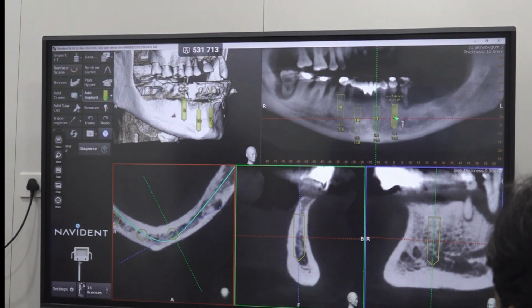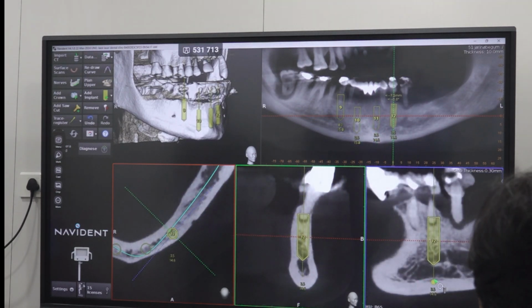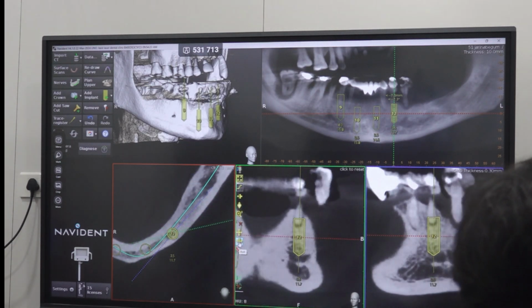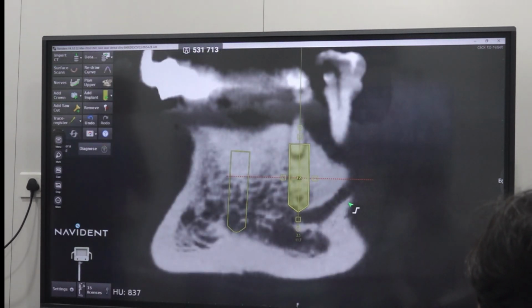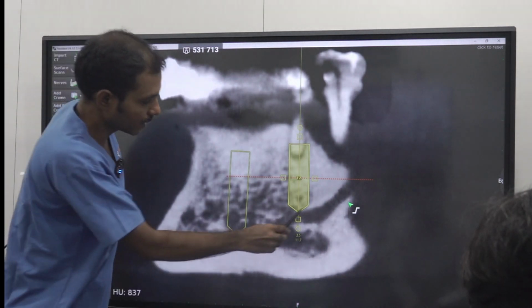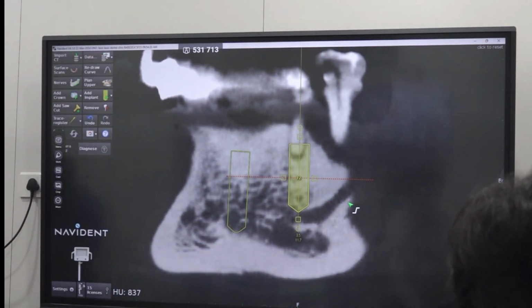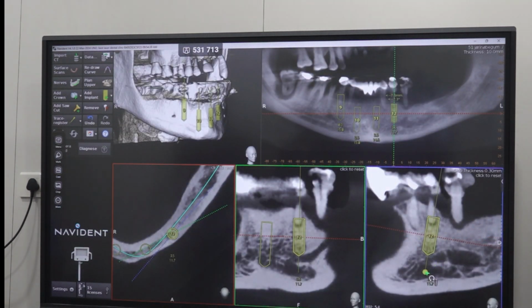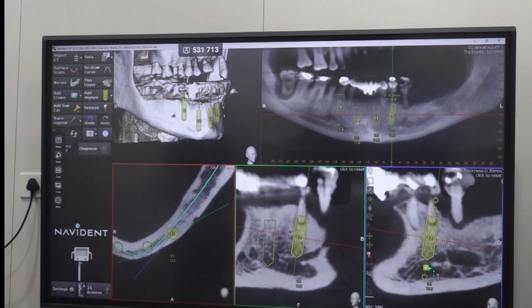So we'll see the second, 3-4. This is a 3-4, not even 3-5, but this anterior loop is coming. So even if you are placing an implant in 3-4, better to tilt slightly mesial. Okay. And select a shorter one.